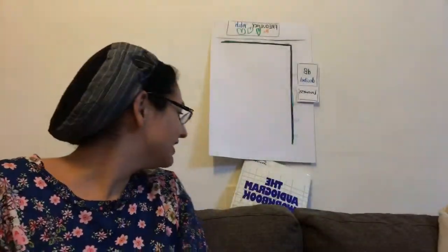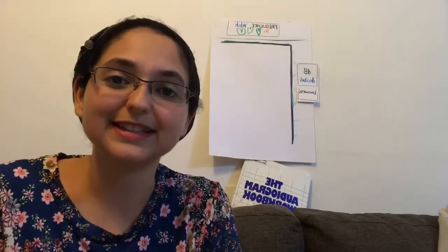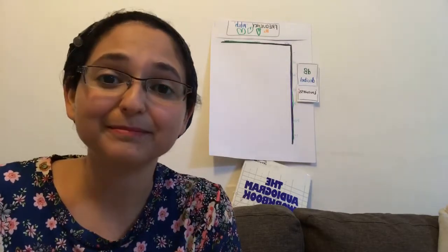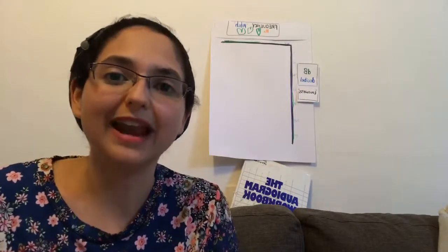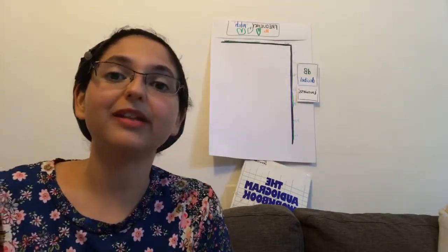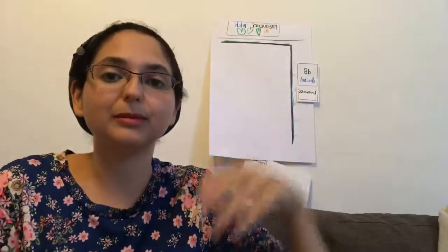All right. So the reason it's important to be able to read the audiogram and understand what the hearing loss is, is because once you know what the hearing loss is, then you'll be able to know what the next plan of action is. If there is a high frequency hearing loss, then maybe the hearing aid is the right option to bring all those sounds that are missing back up to normal.